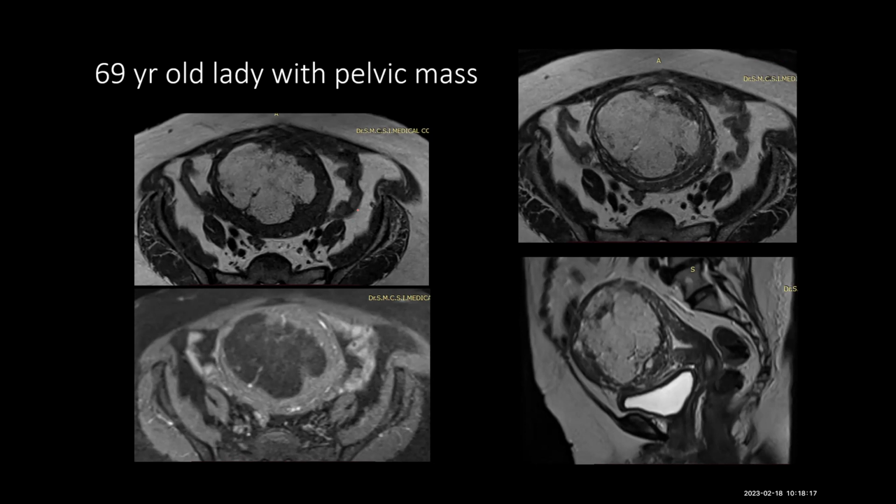All right. I can appreciate that this lesion is hyperintense on T1 weighted images, which shows a few internal hypointense septae. However, its anterolateral margin is slightly indistinct with the uterine body. Yes, the anterolateral margin. However, the rest of the margins are well defined and lobulated. There is no hypointense calcification within this lesion. On the T1 fat sat images, I can appreciate that there is a loss of signal, which means that it is a predominantly fat-containing lesion.